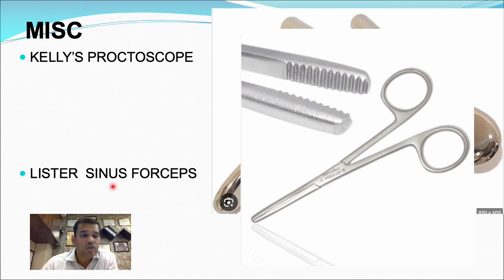So this is used for doing IND by Hilton's method. What is Hilton's method of IND?